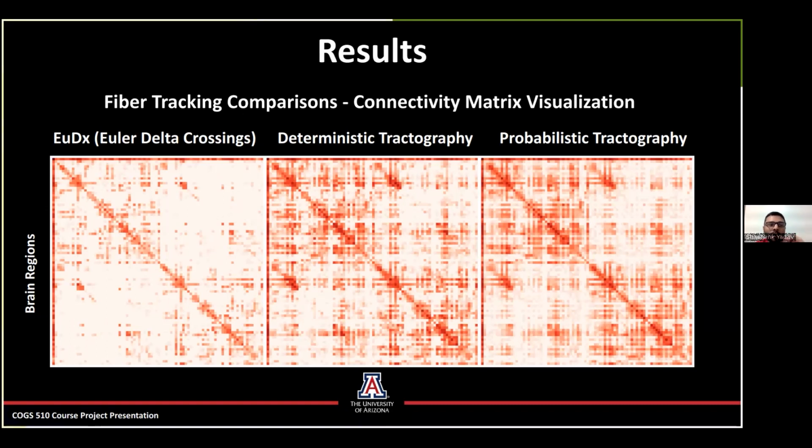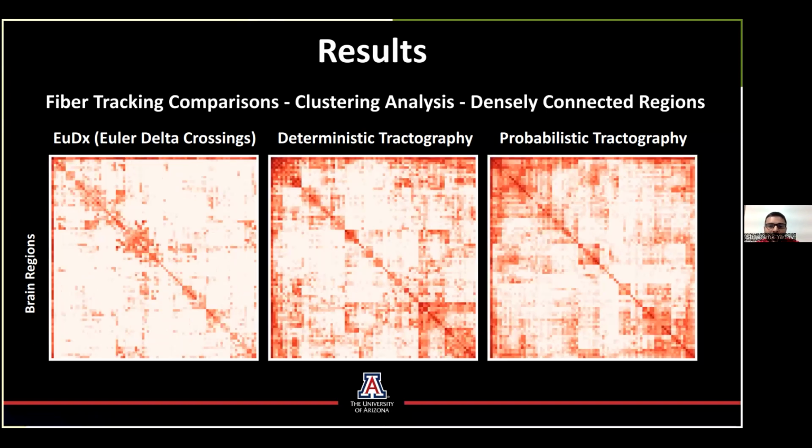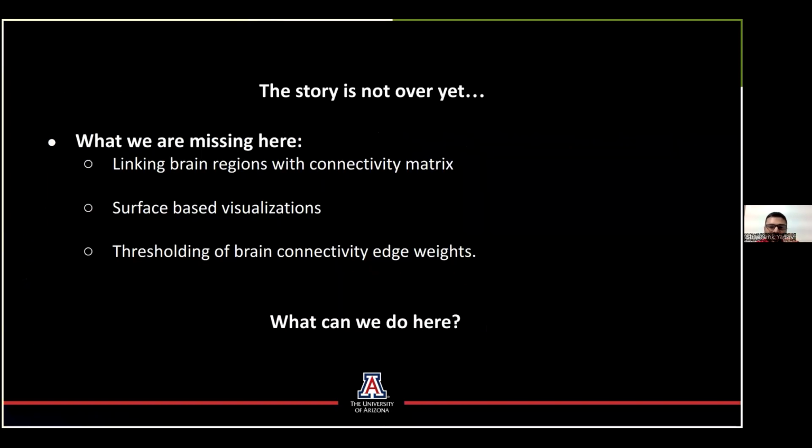If we can overlay this connectivity matrix over a network and then visualize it in a 3D format, then it would be really nice. So that's the next part of this tutorial. We'll focus on linking brain regions with the connectivity matrix, and then mostly surface-based visualizations.